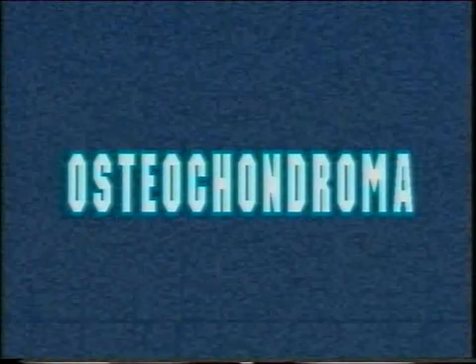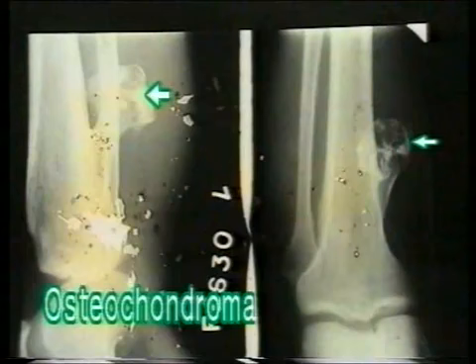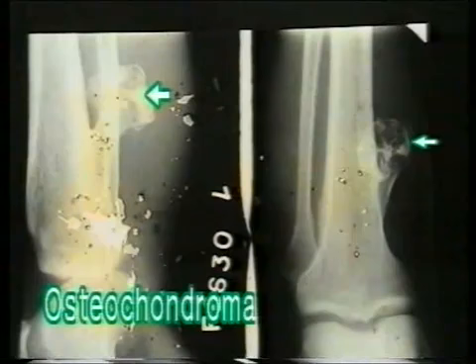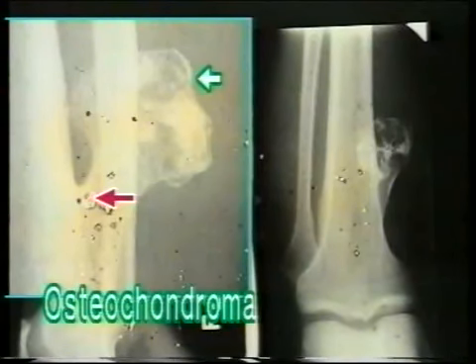Osteochondroma or exostosis. This X-ray shows a bony exostosis of the upper end of tibia. It is an outgrowth from the shaft of the tibia. It has a narrow base as shown by the red arrow, and it then expands like a mushroom near its apex. It is directed away from the knee joint, which is its nearest joint.